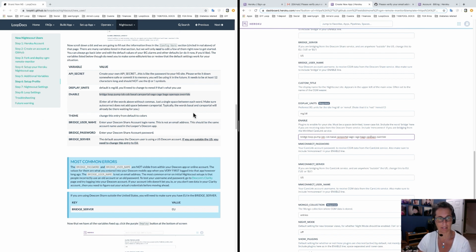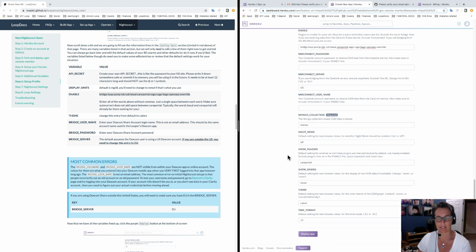So you just copy and paste that whole line. Next, this is not totally necessary, but I love it. Oh, colors is defaulted now to theme is colored colors. So I can actually change this direction here. We're going to leave that there. Perfect. Great. Glad they updated that.